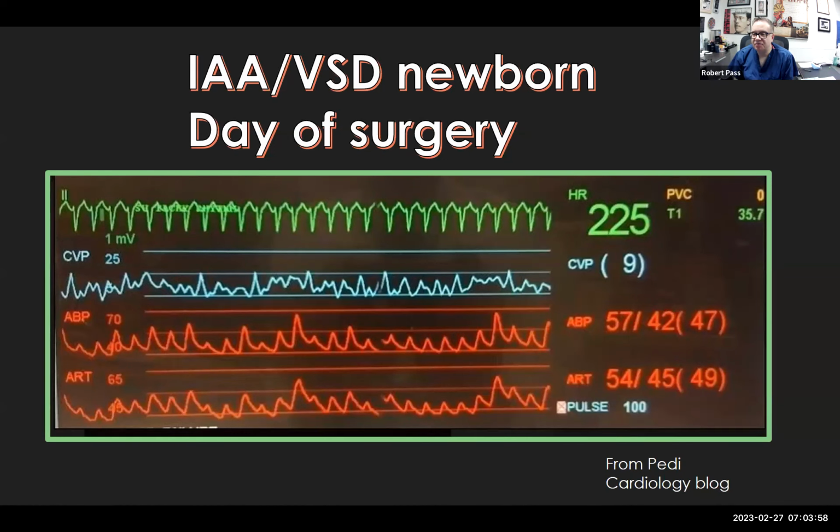So this is an example of how it's useful to use all the information at the bedside in making a diagnosis. And in this case, we see that the CVP is very, very irregular. So oftentimes when I'm called to a bedside and people are asking me whether I think somebody is in JET, the first thing I'll do is just look up at the CVP tracing, because in this case, I think it sort of tells the whole story that there's definitely an irregularity between atrial and ventricular contraction.